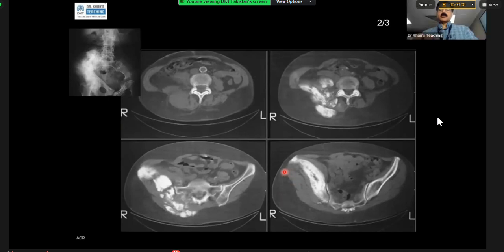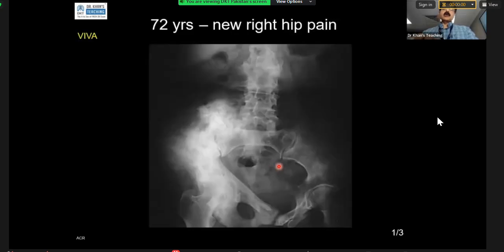Thank you. Excellent. Well done. Now, if you see here, what is happening, this deformity, etc., is all explainable because of the chronic Paget's disease. On this X-ray, the key finding is here.